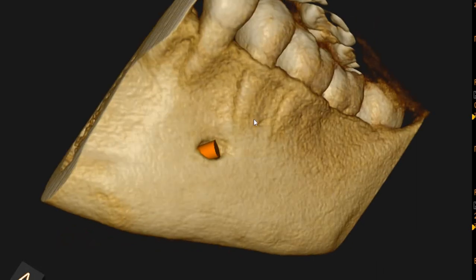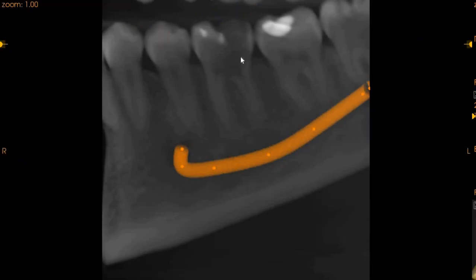Now moving to the sagittal view. On the sagittal view, we can clearly see that the crown cutting has been done and the drilling has been done very significantly close to the interradicular area. Now we're going to move to the mesial aspect of this tooth first.